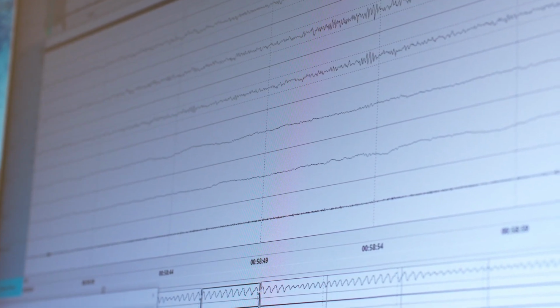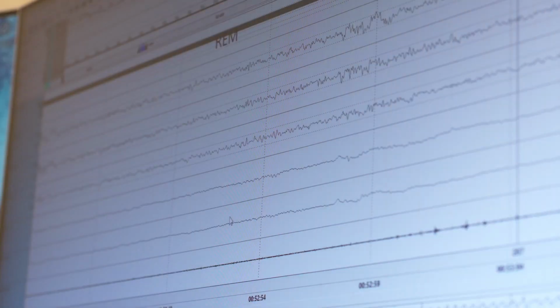Here you can see the first eye movements, even if they're not yet typically sharp, conjugate and fast. But also on the screens before, when the EMG is very low and no more grapho elements are visible, you can already score it as REM. And here's the proof. Yes, these are the rapid eye movements in combination with the lowest EMG of the entire recording. You can also see nicely that the eye movements are in opposite directions. Exactly. So one eye goes left and one eye goes right. There are people who can do that. Consciously, I can't. Me neither.